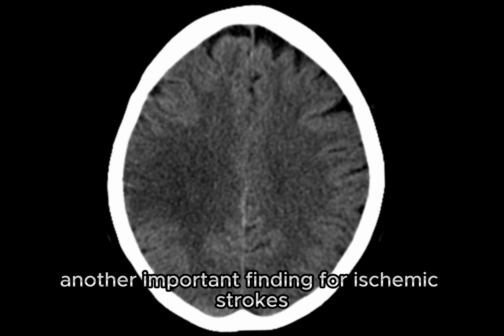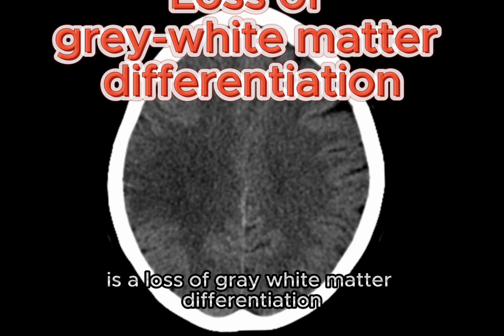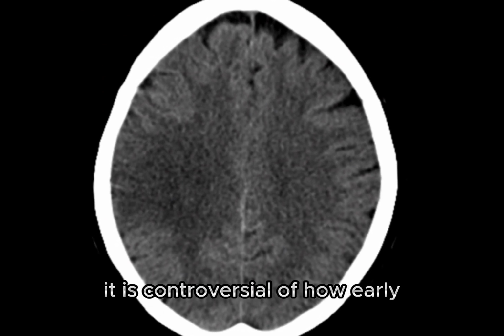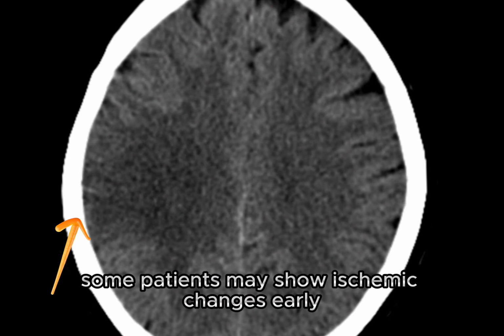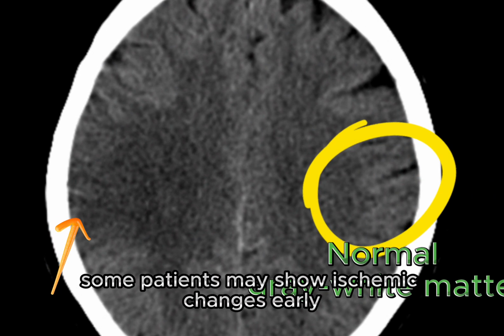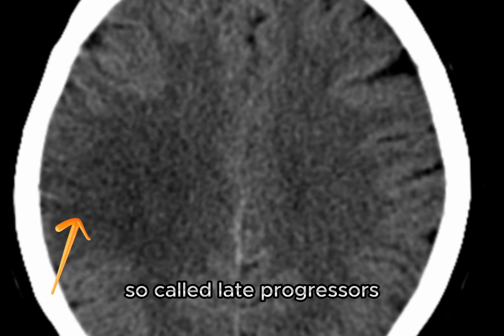Another important finding for ischemic strokes is the loss of gray-white matter differentiation. It is controversial how early this sign will appear on a CT and will depend on individuals. Some patients may show ischemic changes early, so-called early progressors, and others will not, so-called late progressors.